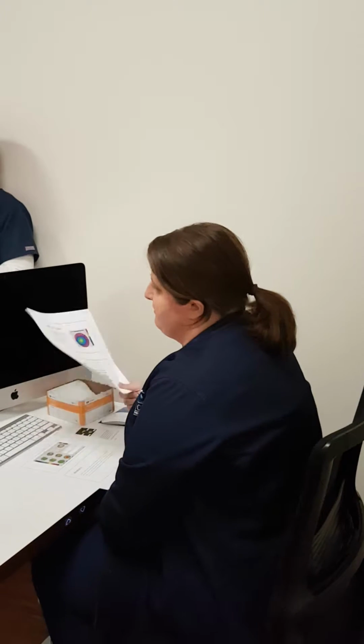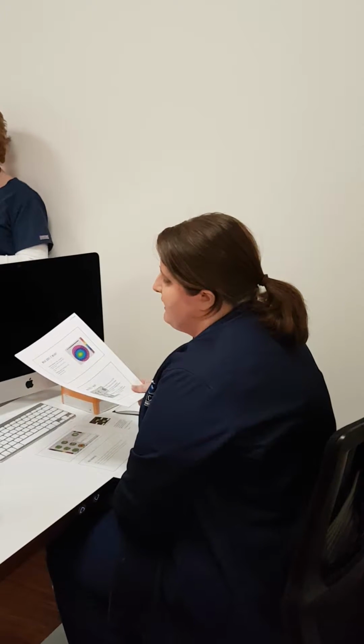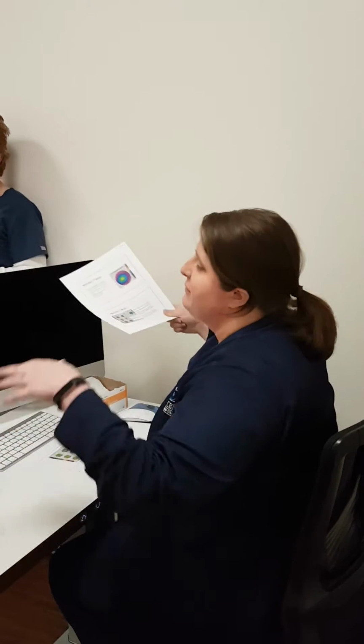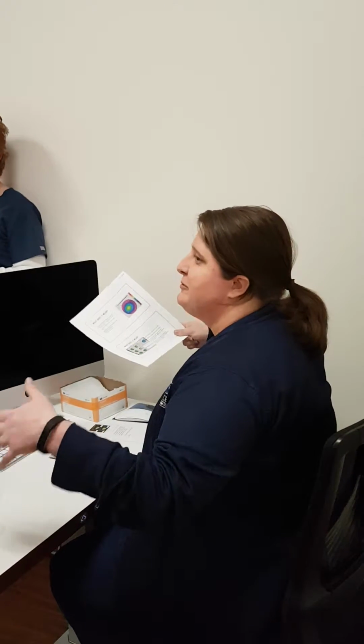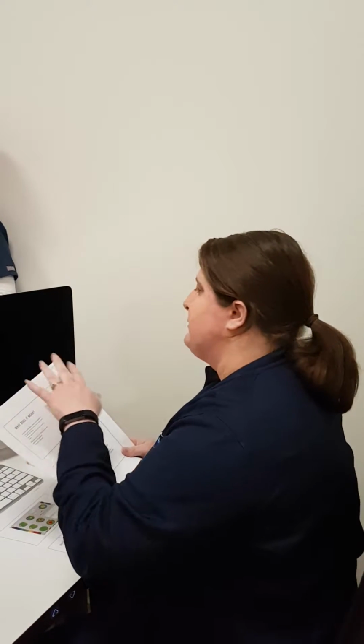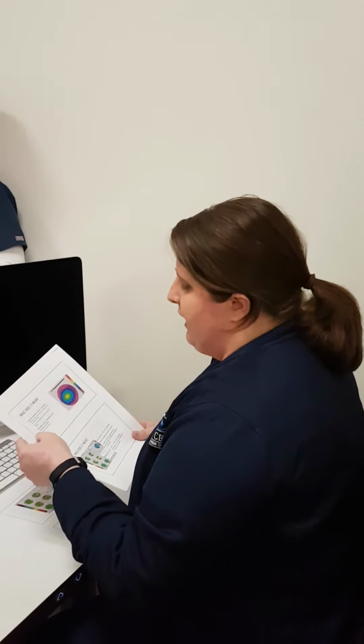Normal pachymetry is the last map on there, and it should be kind of concentric, starting with warmer colors in the center and moving its way out to darker colors. That's because the cornea is thinnest in the center. Normal corneas gradually move to be thicker from the center. It's usually green to yellow in the center, and then moves further to blue, purples after that.